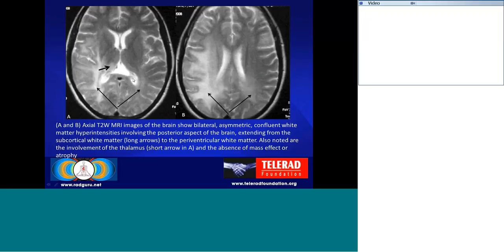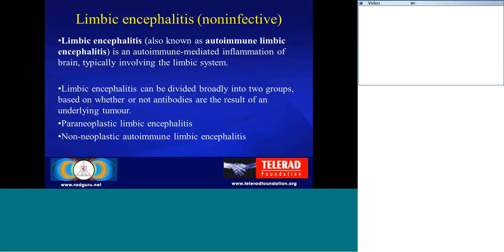So this is a patient T2-weighted MRI. You see that there is a white matter abnormality involving the posterior aspect of the brain and periventricular subcortical white matter. There is also asymmetrical involvement, and there is no mass effect or enhancement. Atrophic changes are also not there. So by CSF analysis of measles antibodies, we can definitely say that this could be subacute sclerosing panencephalitis.